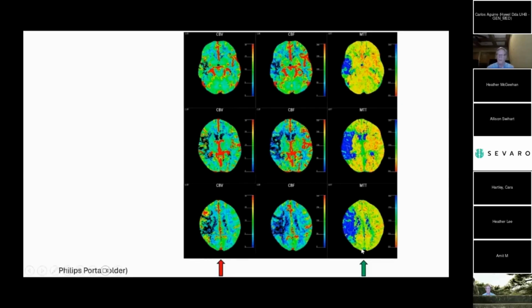So anyway, here's the brain, right? Normal's over here on the right side. It's going to be all this yellow and orange. Abnormal, 145% or more, is going to be green through blue. So all of this is the affected hemisphere. This is a huge stroke, right MCA distribution involving the anterior and posterior frontal lobe. Now let's jump over here to the CBV.